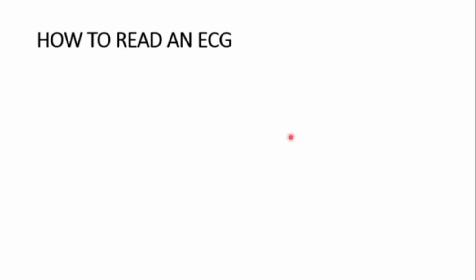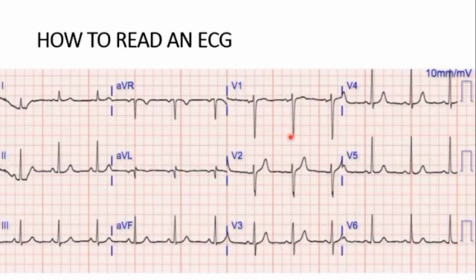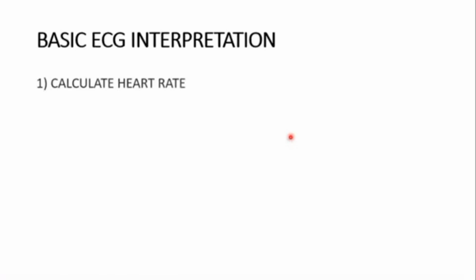Now the important and interesting part: how to read an ECG. Imagine you are posted in a government hospital and your senior doctor gives you this and asks you to read the ECG. What do you have to do first? First, calculate the heart rate.